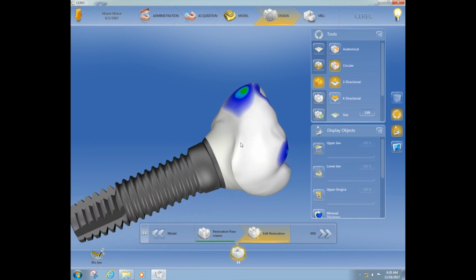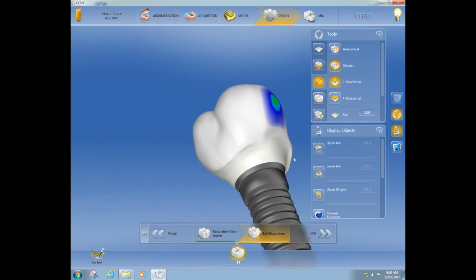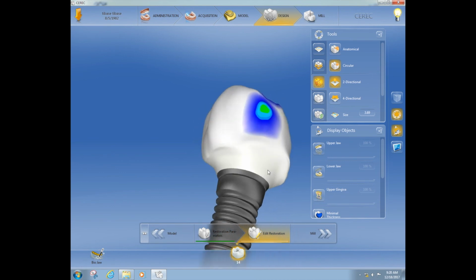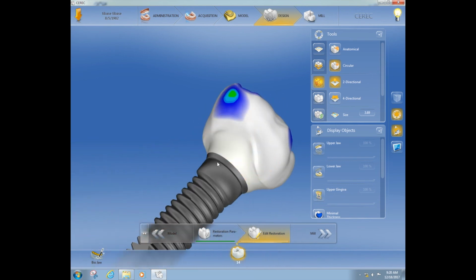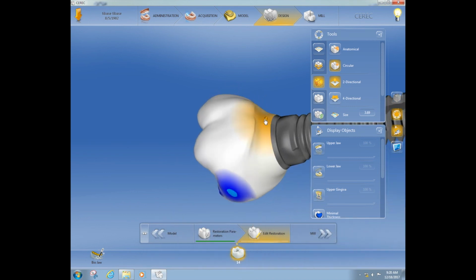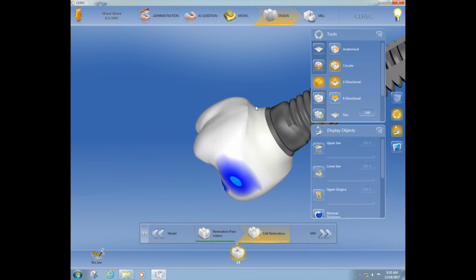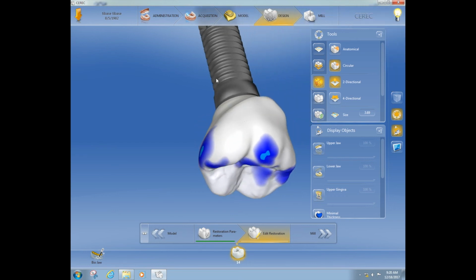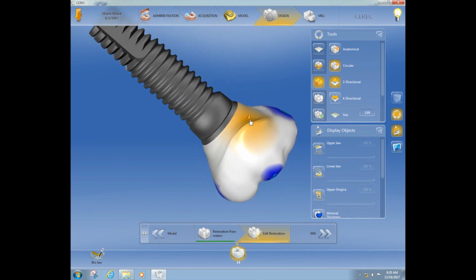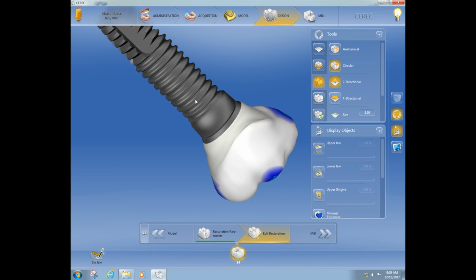Look around, you can see you don't want to place that like it is. That will mill with that anatomy. So yes, this will add tissue strength, so be careful, but I'm going to add just a little bit. You see I'm just bulking it out a little bit, just so I have room to smooth it out. See here, probably need to bulk it out a little bit.